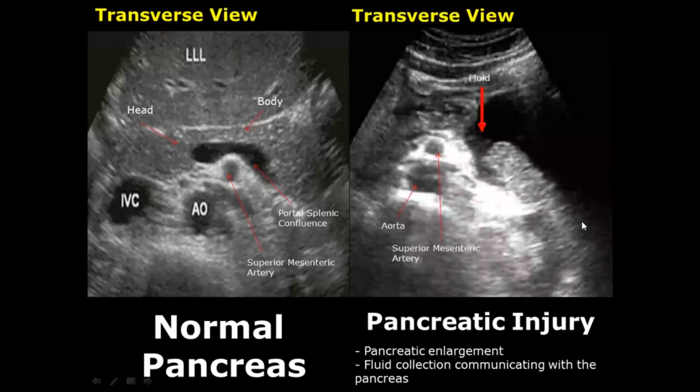Pancreatic injury can lead to enlargement of the pancreas and also fluid collection that is communicating with the pancreas due to injury.